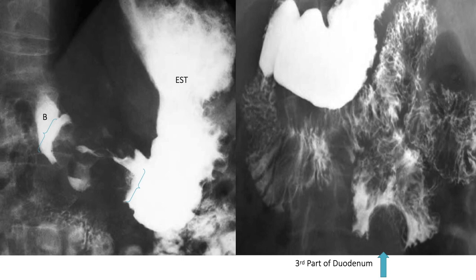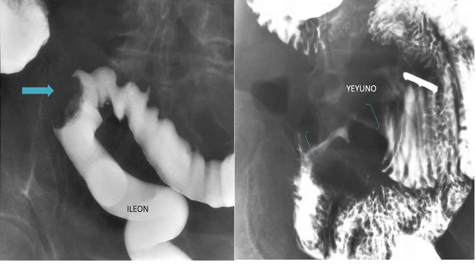Then we go to the ileum, and now you can see there is another filling defect. You see there is something inside which made it impossible for the barium to cover that area. At the end of this presentation, I have some graphics, some drafts, that give you another point of view so you can better understand these kinds of abnormalities.